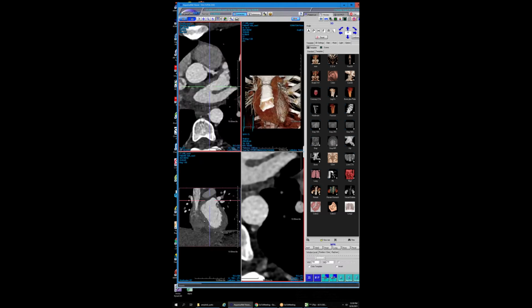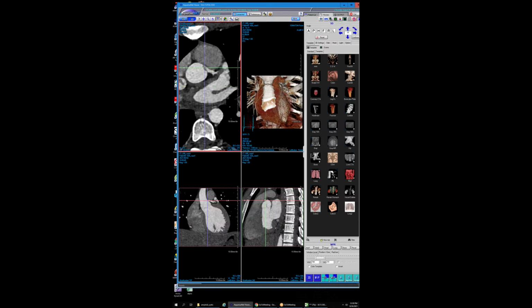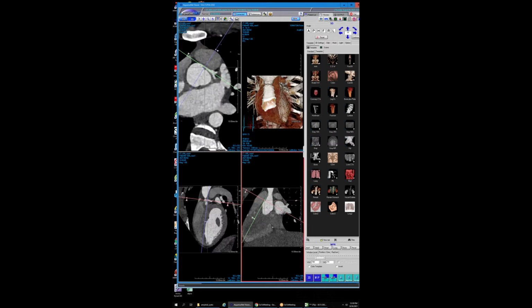We don't see a lot of interarterial lefts. We see a lot of interarterial rights, and some people are symptomatic from them, but the vast majority of those are incidental findings. The interarterial lefts are bad news, and you can see how compressed this vessel is.